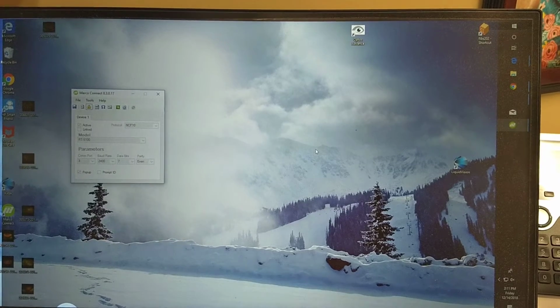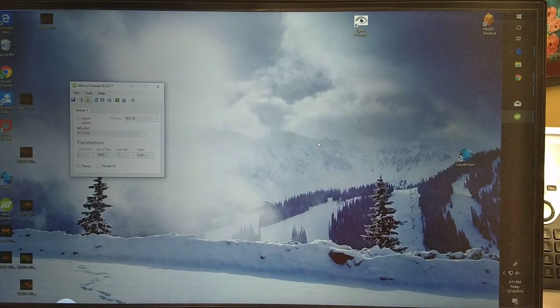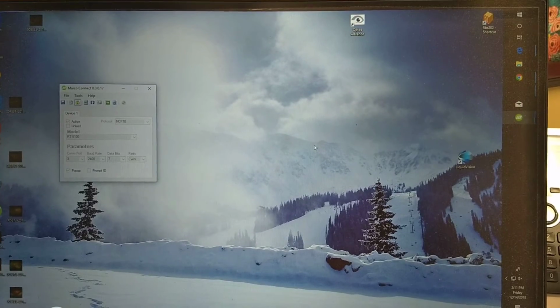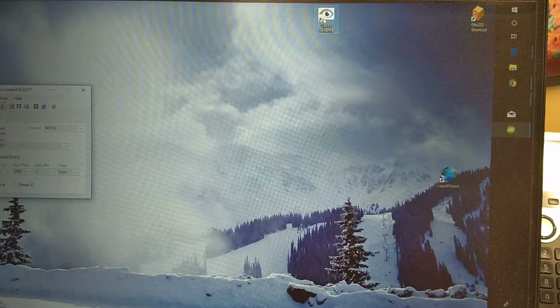I messed around with it with a few patients. I have a little bit better video, I hope, of the new software. So again, you log in, and the website that we have to log into, I keep right up there. And all you do is put your mouse and double click it.